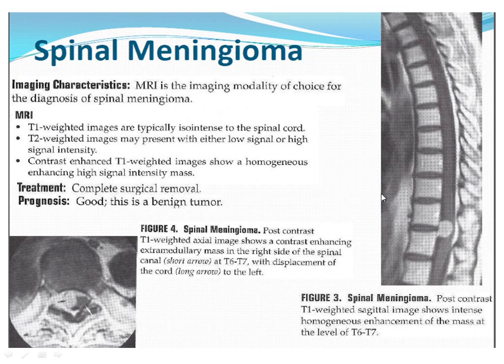Here's another image of a spinal meningioma. Occasionally, you can see a little bit of an enhancing dural tail that goes along with it. That's another good reason to add contrast, because this little tail gives you another clue that it could be a meningioma rather than something more concerning like a metastatic lesion.